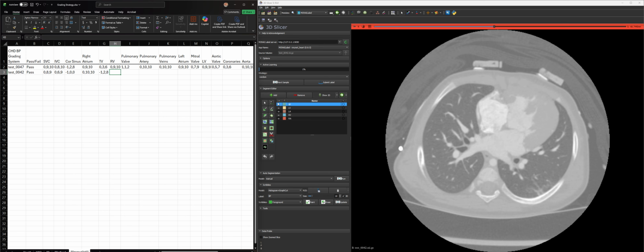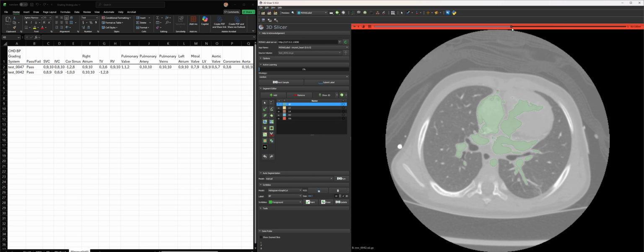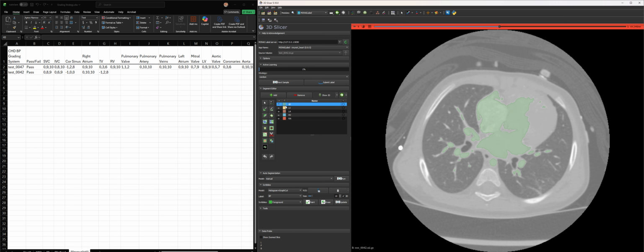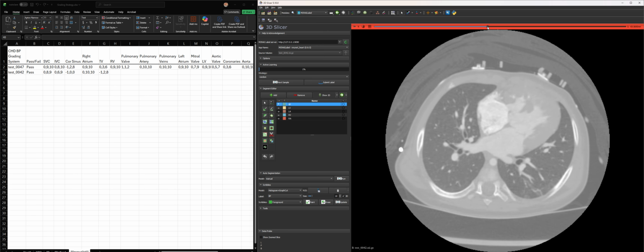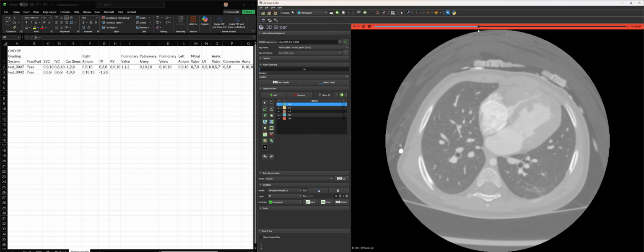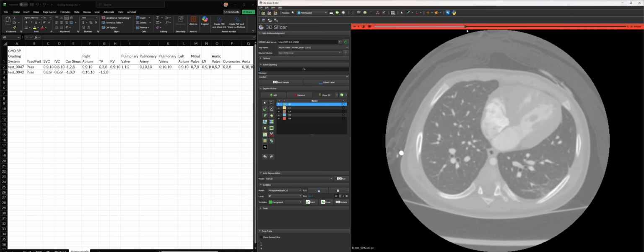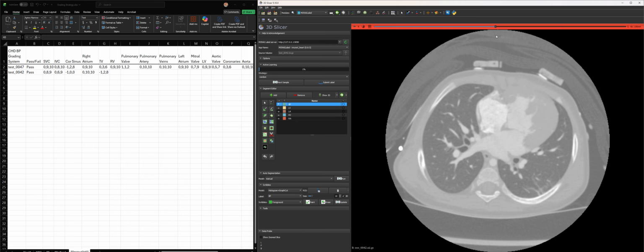All right, right ventricle. So there is a VSD in this case. That's a pretty crisp border. The scan was fast enough to sort of stop the heart. There's very little motion of the trabeculations, so I have high expectations. This is also one that's in end systole.